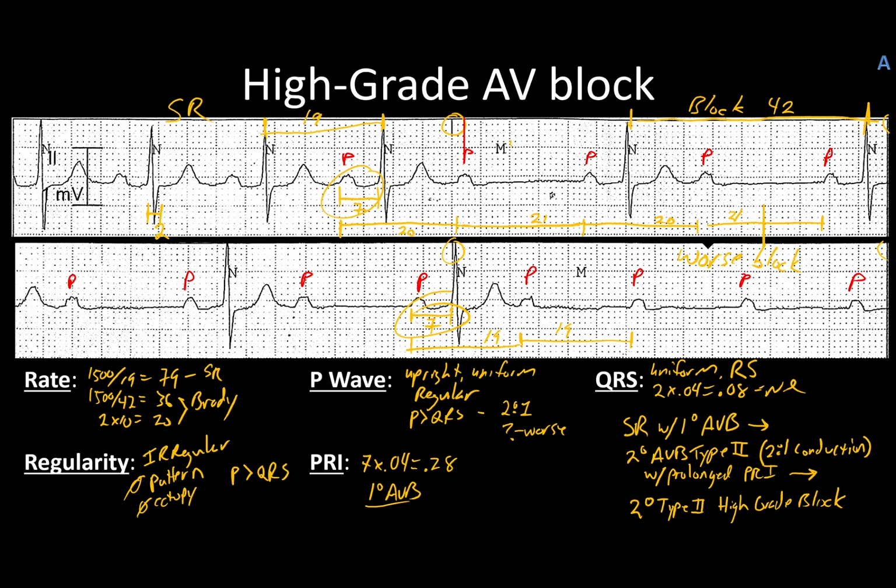That initially you just drop one and oh, okay, it came back and then dropped another, and then you drop that one and you drop this one, and rather than the pattern continue, it actually gets a lot worse. And you drop 4, maybe even additionally 5 or 6 beats in a row before it kicks back on. That's what we're trying to illustrate here. At the end of the day, check on your patient, take care of them according to ACLS protocol.